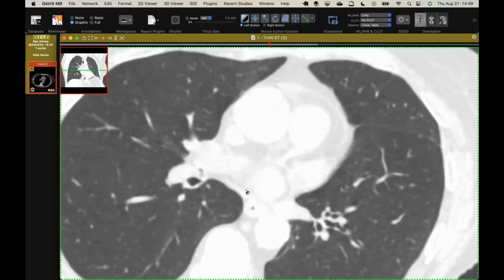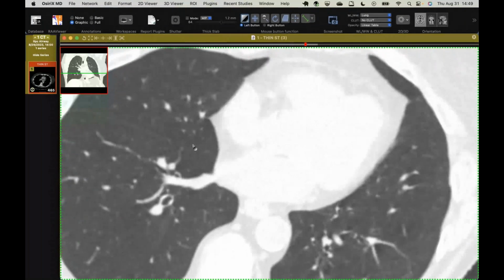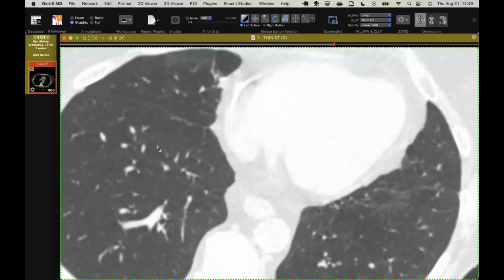Some dilated airways in the middle lobes. The middle lobe was pretty tight, so she's got a little bit of mucus there and a little bit of bronchiectasis. So it may have been brewing for a while. It's just now declaring itself. And she may have been on enough medication for her PMR that it was sort of suppressed a little bit.